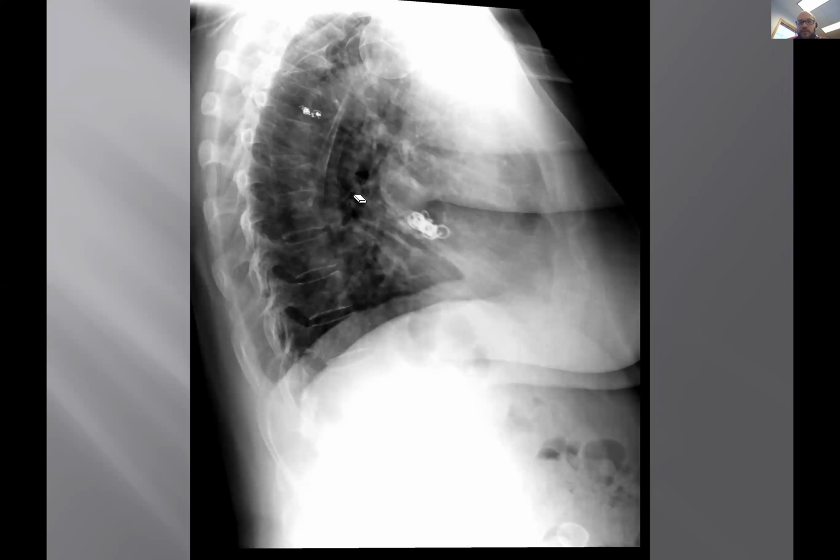She looks a little hyperkyphotic and maybe osteoporotic. Yeah, I agree with both of those, that there's some diminished bone density, and I think even the compression fracture is contributing to the kyphosis. Or, yeah, so I agree with those. But there's another finding. Those are our alignment and bone findings. Keep going. Technical, alignment, bone, cartilage, soft tissues, all 4 corners of the film.